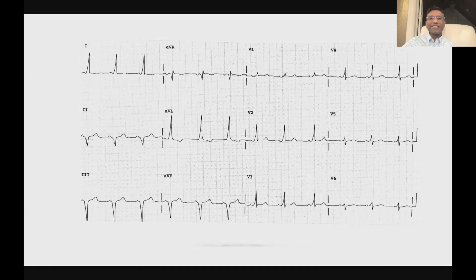Okay. I might be hearing some background conversation. I thought it was someone volunteering to speak, but let's get someone to just look at it and give us a diagnosis or the main findings on the tracing. Do I have a volunteer? Otherwise, we can pick someone and keep going.